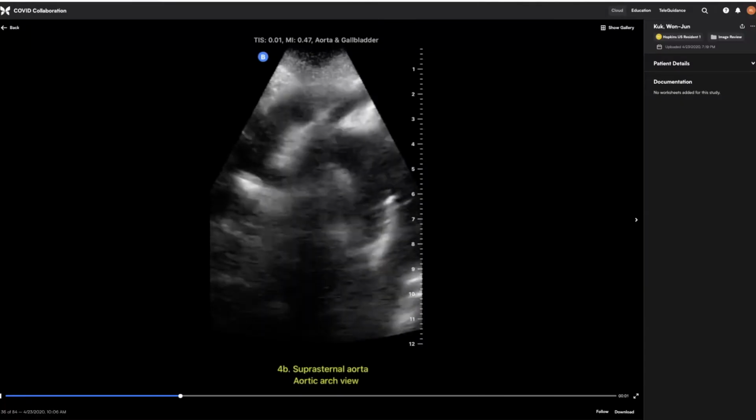That's great. I just wanted to show you maybe one more, and then we can get to some of the submitted images, but I thought this was really cool. So this trainee completed the Hopkins Ultrasound Challenge, and one of their assignments was to get this view.